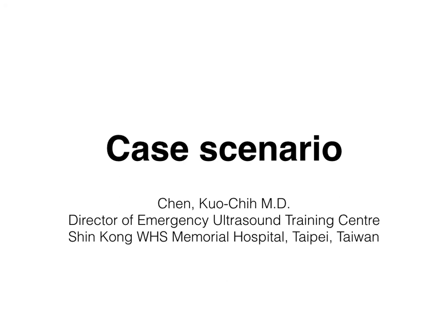Okay, the last one, challenge your eyes, educate your eyes. So I will show a lot of video clips to test your eyes. Okay, case scenarios. So before we start, I would like to propose a concept. When we scan every area from the head to the toe, maybe we can have some kind of mnemonics to remember what to look at. But it's only a preliminary concept.